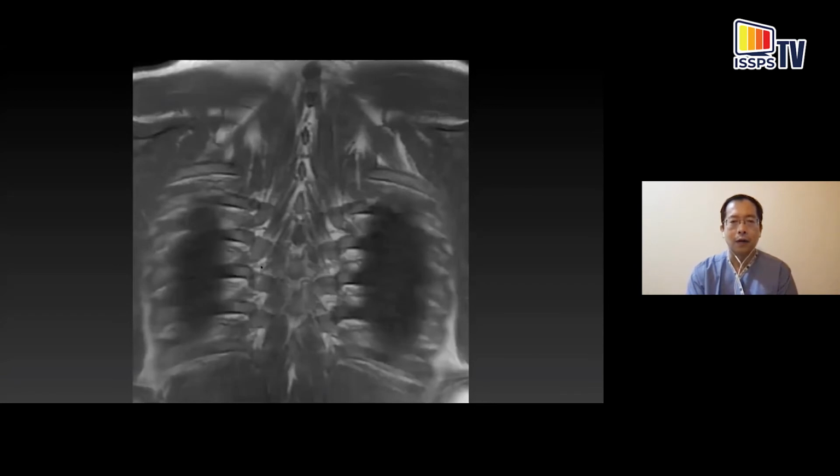The tips of the large transverse processes in the mid-thoracic spine, you can see them very nicely here. You don't see them here anymore, partly due to the curvature, but also because the transverse processes are smaller as you approach the inferior part of the thoracic spine. This then is the costotransverse joint over here. And you can see that immediately inferior to the transverse processes, your working space allowing you to access the fatty tissue within the thoracic paravertebral space itself. So identify the costotransverse joint if you can, and that's also another landmark to tell you the most lateral landmark of the TVPS.